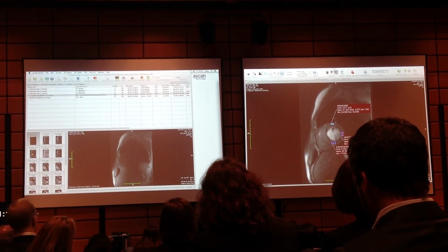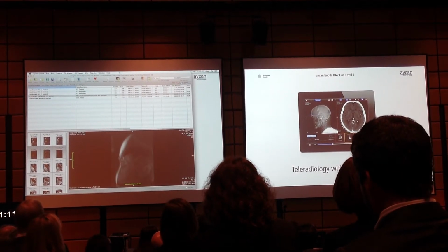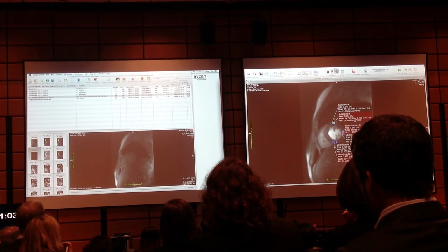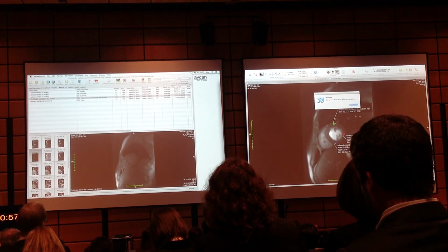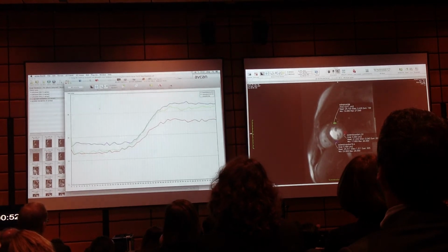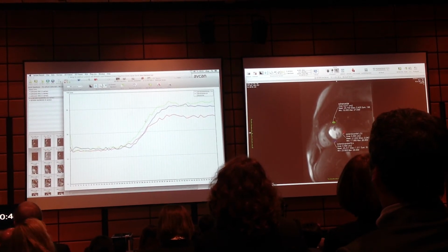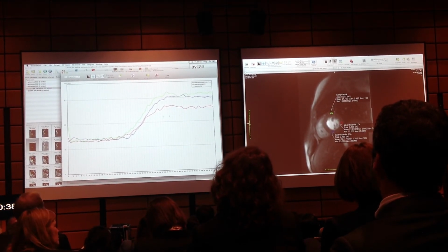I'm copying my ROIs, and we'll bring them also into the REST 4D dataset. Okay. And again, with coil correction, pull the baselines over each other, and then you see in the rest the curves are almost similar and have the same slope and get to the same level.